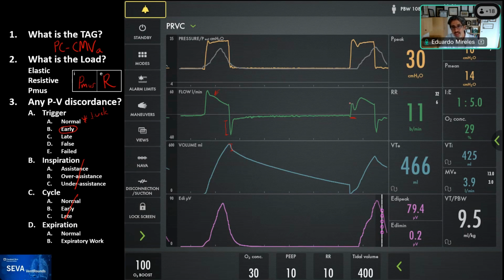So in this case, that lower peak pressure you see here was because this patient actually had active expiratory muscles. Even though I cannot see the expiratory work as usual, because there's so much resistance, this patient was contracting her expiratory muscles, and that's why when the breath started, it doesn't get as much peak. Awesome.